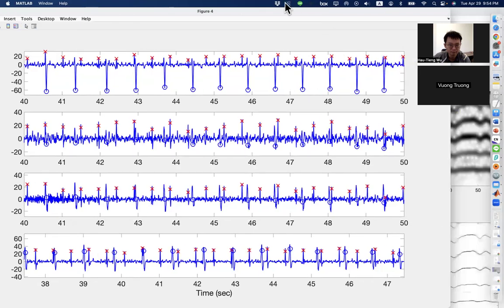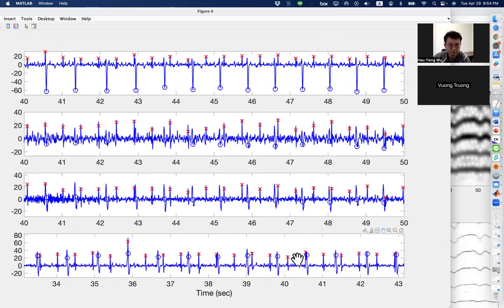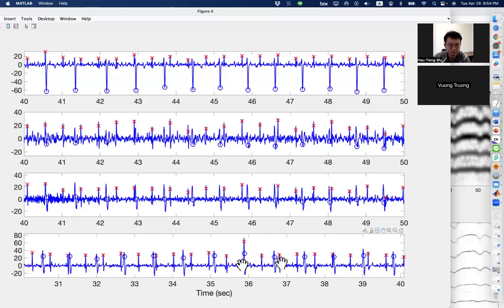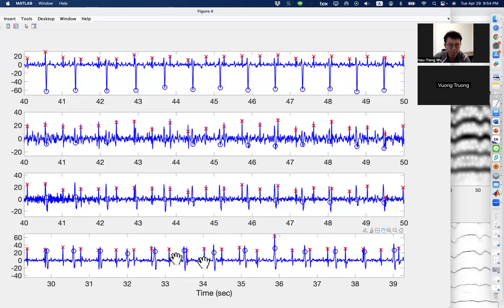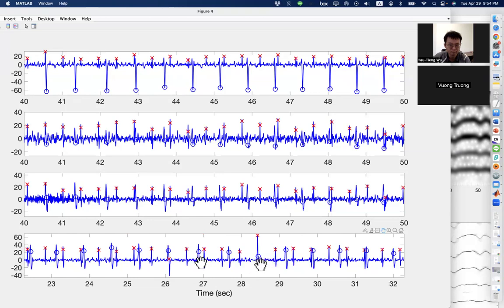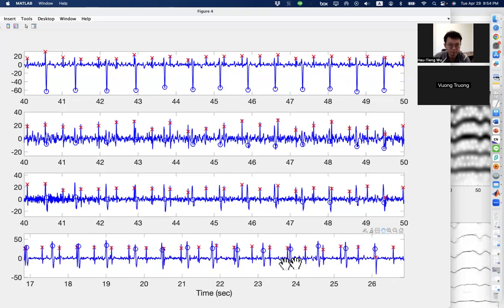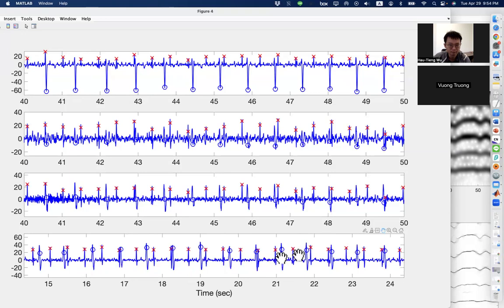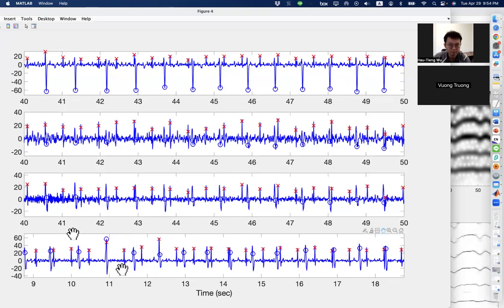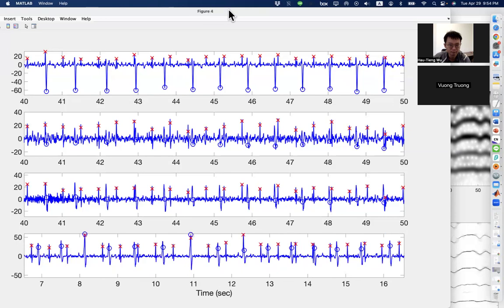So it is kind of more challenging to just use height criteria or some basic ideas. Well, you need to do some spatial filtering and so on, so that you can get the maternal heartbeats correctly. But you can see that maybe it's not so useful. You get some fails. But this case is still very good. So you can still get very good maternal R peak detection just from the fourth channel.